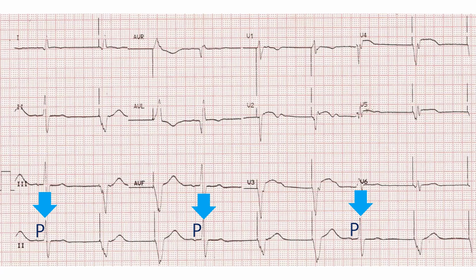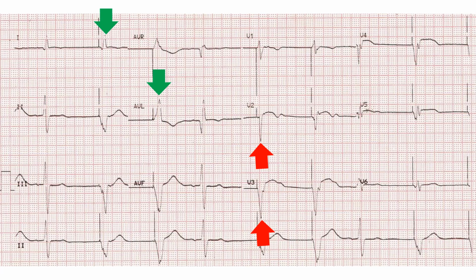This would indicate that the indication for pacing would have been sinus node dysfunction, as no dissociated P waves are seen. Dissociated P waves would have suggested complete heart block as the reason for ventricular pacing. QRS complexes have left bundle branch block morphology, negative in V2, V3 and positive in 1 AVL. This is seen with right ventricular pacing.